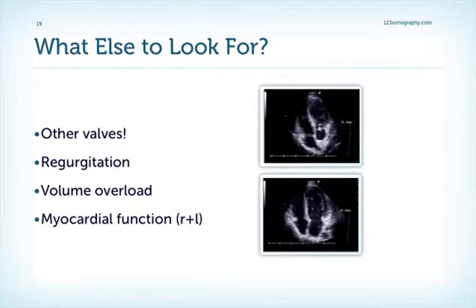One of the biggest dangers in echocardiographic diagnostics is that we always tend to focus on the most prominent pathology, for example, the vegetation, and that we then forget about the remaining part of the heart. This can be detrimental because, especially in endocarditis, other things play an equally important role. For example, the other valves.